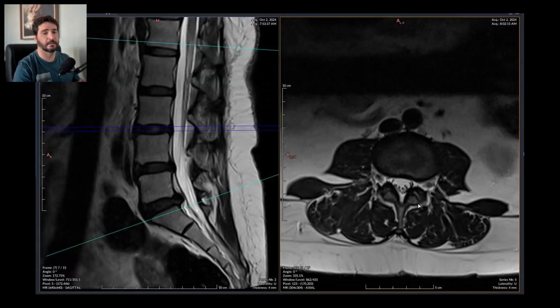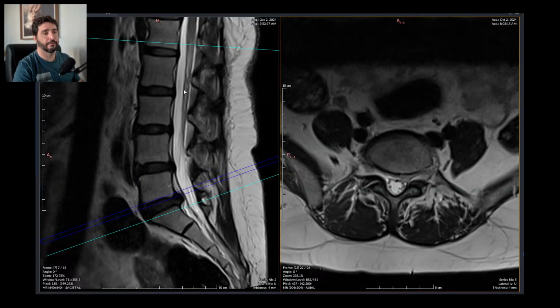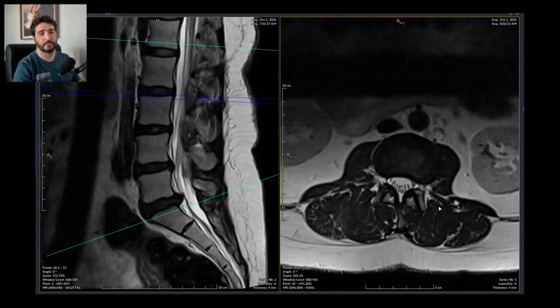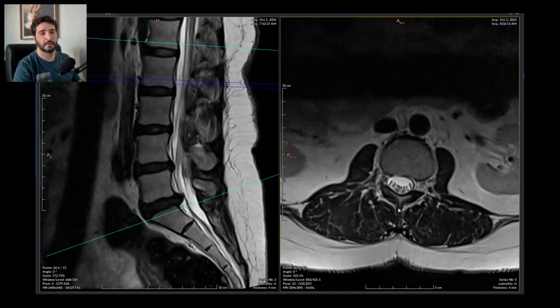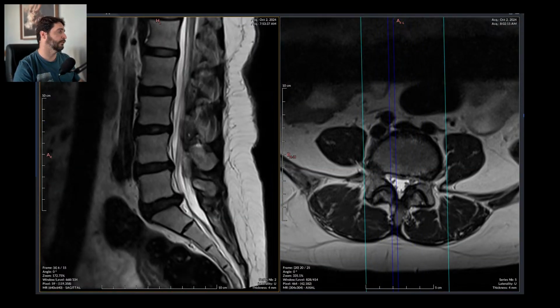And this is it. Mild to moderate arthrosis with synovitis, 4 extruded discs, some degenerative disease on the vertebral bodies and plateaus, thickening of yellow ligaments, mild stenosis of the L5S1 vertebral canal. So this is quite painful. This is plenty of motive to be in quite some pain.